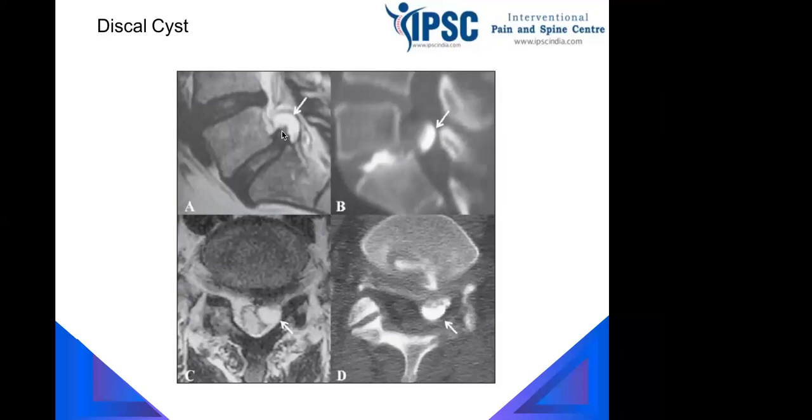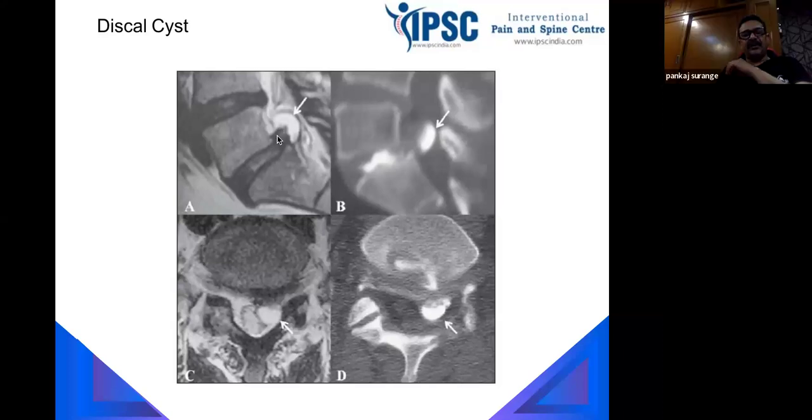Discal cyst, high intensity zone, inflammation process going on, it may form the discal cyst. In this case, we have to decompress the cyst here.